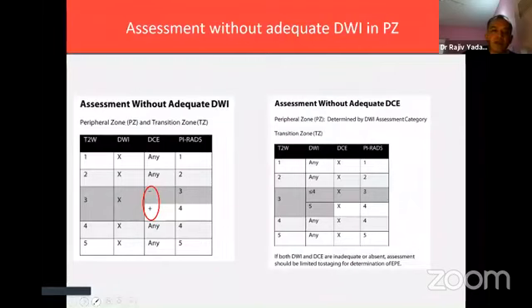You see here, it means that diffusion weighted image could not be interpreted well. So there, the sequence of contrast enhanced may help a little bit to the radiologist. Now, these are very limited circumstances. So what should be done?